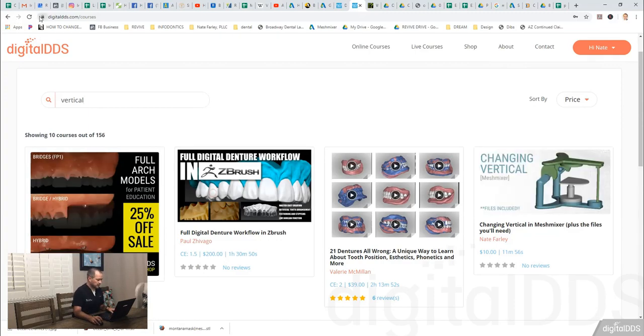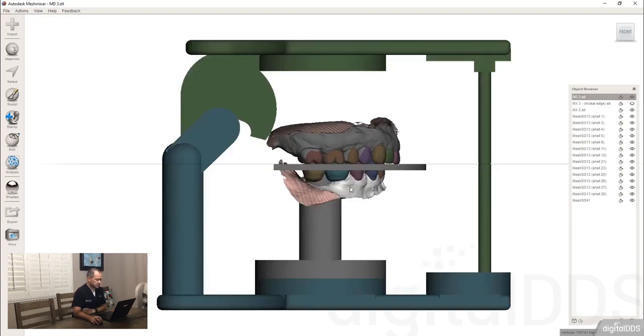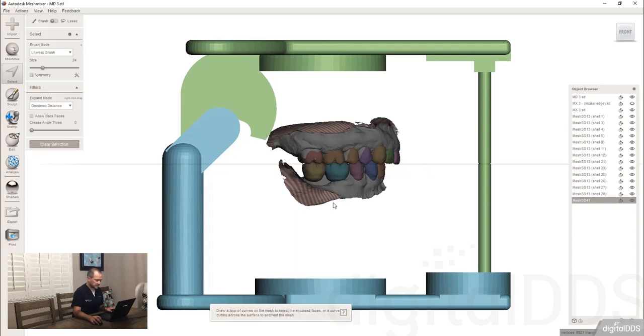So until it gets into the shop, you're going to want to just look for that and purchase that. But going back over into here, the idea is pretty simple. And I use this to align, but then I don't need this anymore. So I normally click on this, G to expand, and I just delete it.